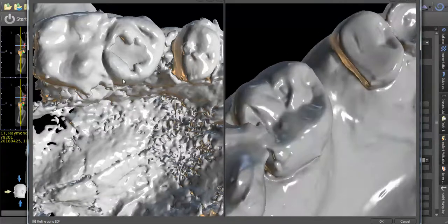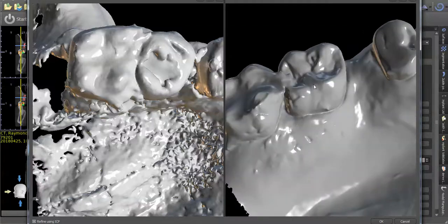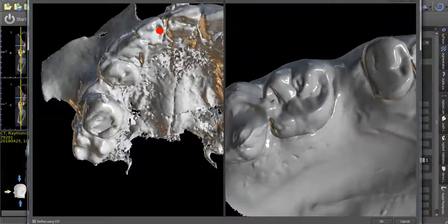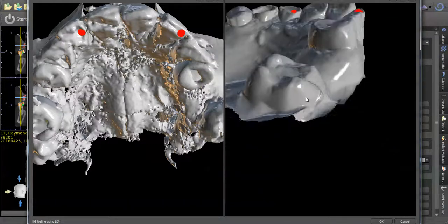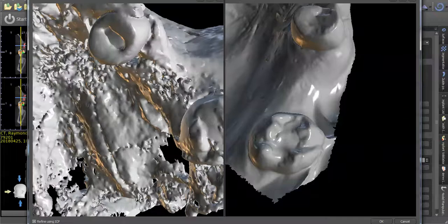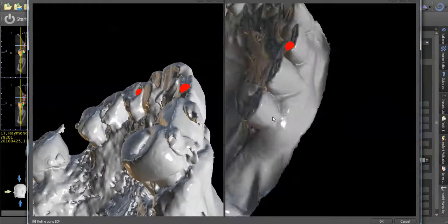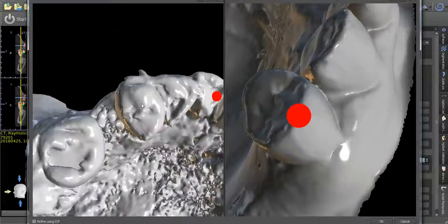This is a crown. This might have a little bit of scatter. I don't think it's going to be very accurate. You want at least 4 points, this is 2. See how nice and accurate this impression is compared to the scatter I'm seeing here. So then what I'll do is get some cusp tips if they look pretty good. This would be a decent cusp tip. I want to get something over here.